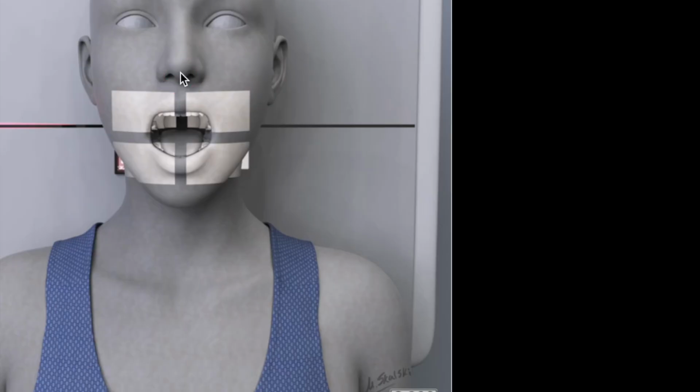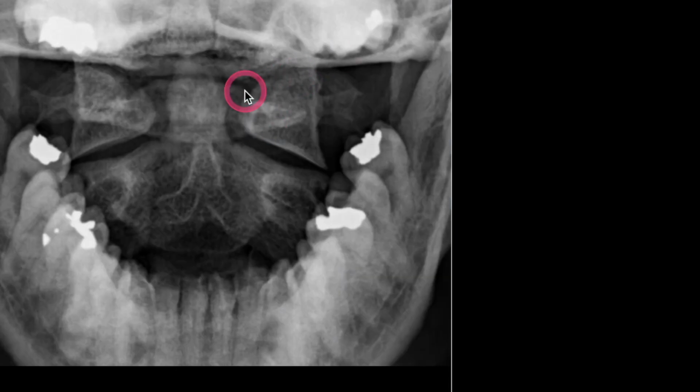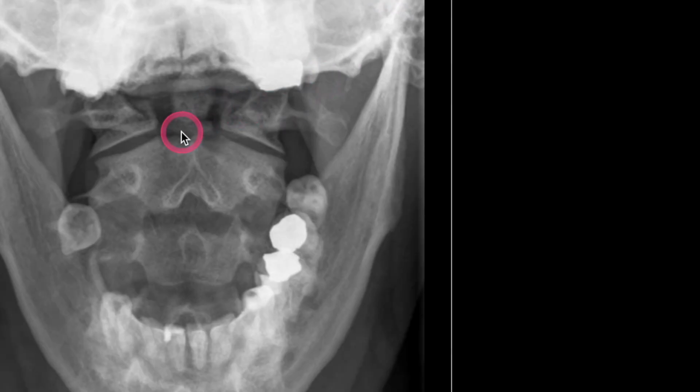The patient's told to open their mouth widely, almost as if we're instructing them to eat the x-rays, which is kind of funny, but it also demonstrates how cool imaging is. You can assess someone's spine through their mouth. And this image just shows a normal dens. There's no fracture here. But in this image, you can see there's this lucent line on the x-ray, and that's depicting a fracture of the odontoid process.